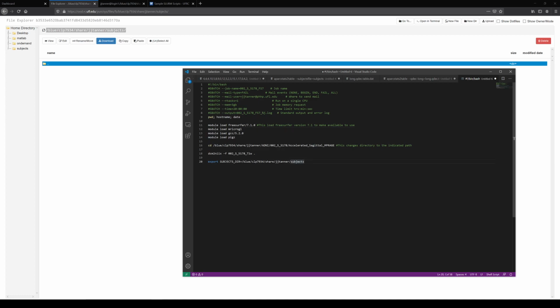And so that's going to be our output directory. So now what's the command to run FreeSurfer? recon-all. And there's a little bit more to it, but that's the gist of it. So we're going to set our output subject. I'm just going to keep the same subject identifier. It's much easier to do that than create a new subject.